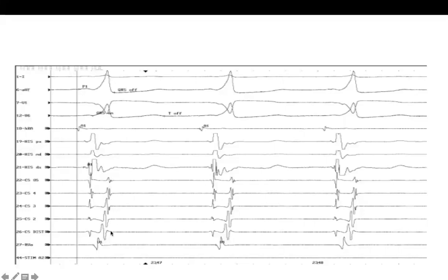You said the early activation is in the distal or proximal? I see it as if it is RA. Early activation, RA. RA is sinus rhythm, so you don't depend on it. And the pacing? It's not pacing, this is just a line.